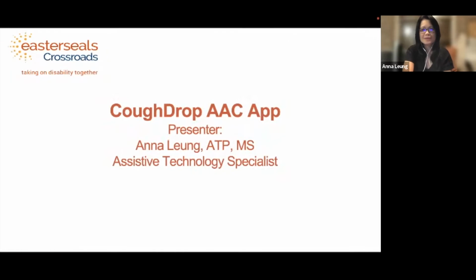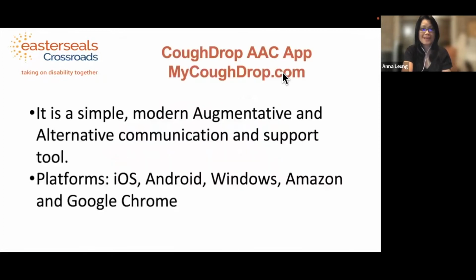This tech tip is about the CoughDrop AAC app. AAC stands for Augmentative and Alternative Communication. Yes, CoughDrop is an AAC communication and support tool. It is available on many platforms, such as an Apple iOS device, Android mobile device, and Windows. You can download it from an Amazon account. You can also use it on the Google Chrome browser.